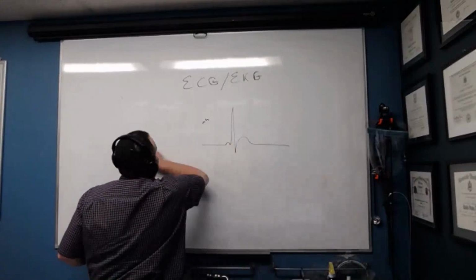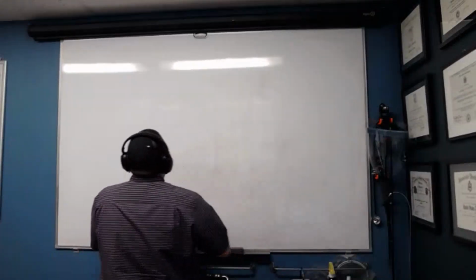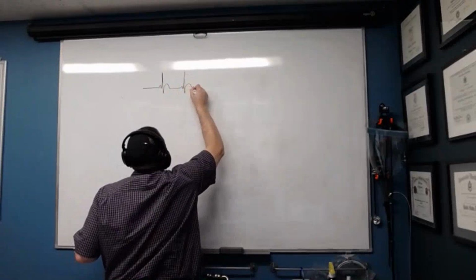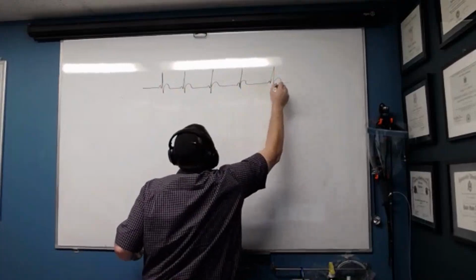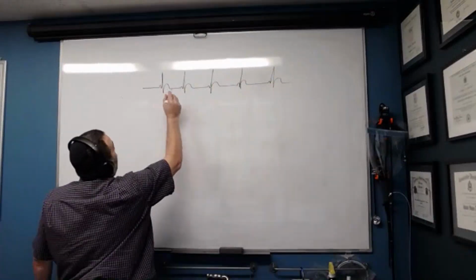Now, let's take my word for it, that up on top will be my typical ECG. It's always regular. It's always ba-boom, ah, break, ba-boom, ah, break. Disregard this, this is too fat over here. But you got your ba-boom.